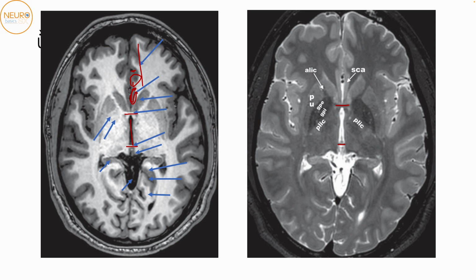Okay, so this would be the area of the medial frontal hemisphere located below the corpus callosum. On the medial surface, you'll first get the superior frontal gyrus a little bit. Then you will get the cingulate, and then the subcallosal region. Then you have the temporal gyri located over here. These are your superior, middle, and inferior temporal gyri. You have the insular cortex here and the very obvious Sylvian fissure over here.